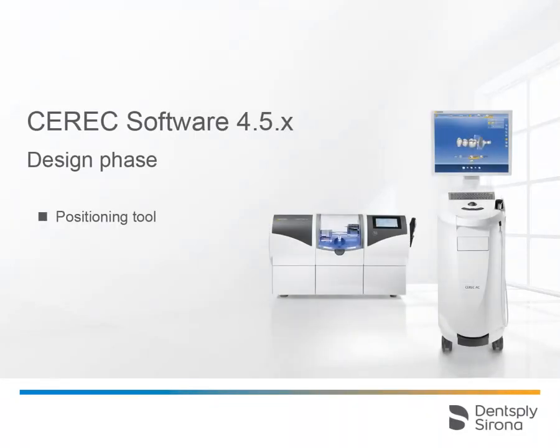Welcome to this video tutorial on the topic of the positioning tool. This video will show you how to use this function, which allows you to move, rotate, and scale the restoration, and therefore align it in the dental arch.